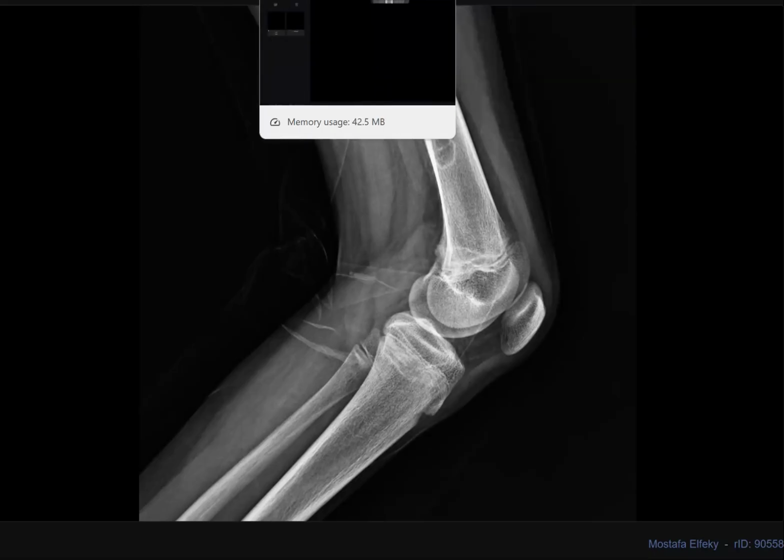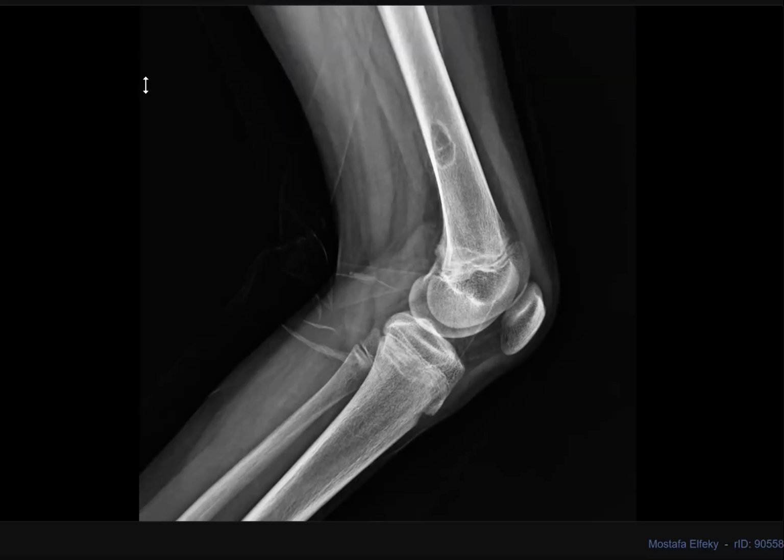Before giving my diagnosis, I would like to see the orthogonal view. What if I told you the patient has multiple similar lesions? Then this is most likely a fibrous cortical defect. In multiple, it is multiple fibrous cortical defects or multiple non-ossifying fibromas.